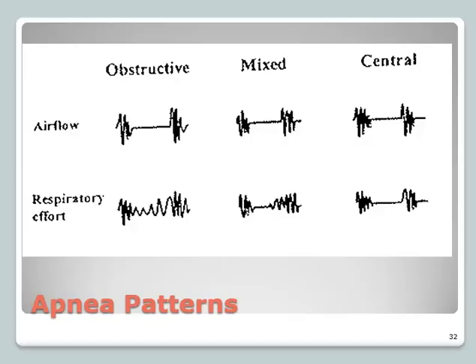So you'll typically see mixed apneas in patients that are very severe with their obstructive apnea, or they just have too much of a response to the event, where they're hyperventilating too much, creating that bit of a central component. I know you'll ask this. It's never opposite. It doesn't ever start obstructive and then go central. It doesn't happen. It's always central and then obstructive.